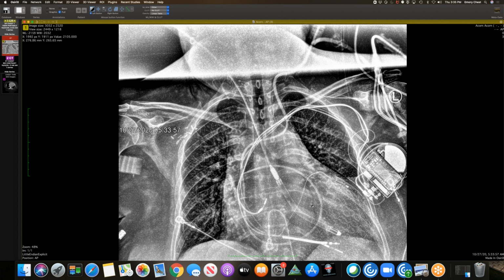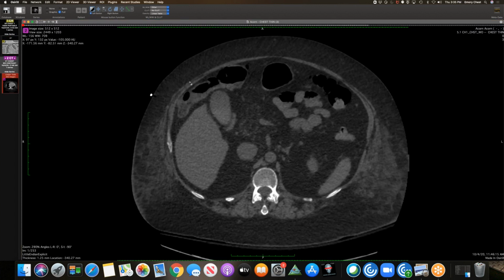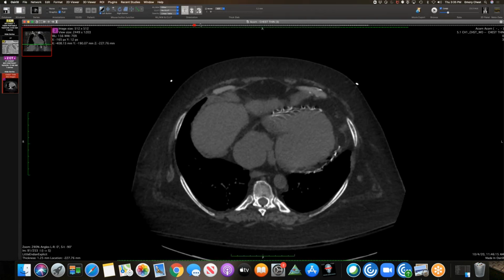Right. Yeah, and no history of any other extrathoracic tumor malignancy. And what this turned out to be, because Travis, before you go on, what was the material in her breast implants? Was it silicone? It was silicone.